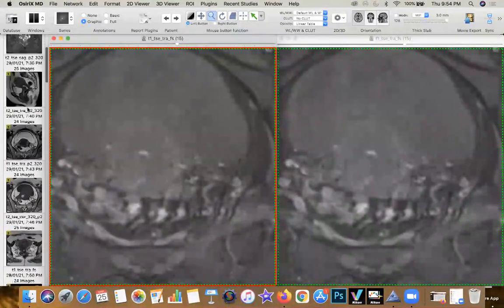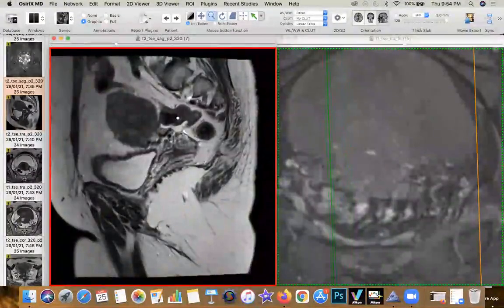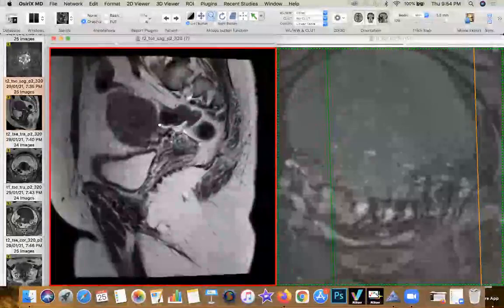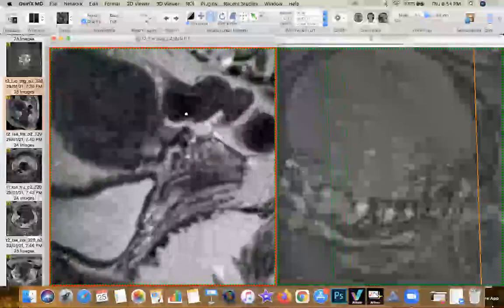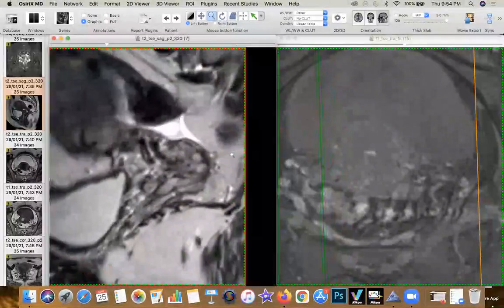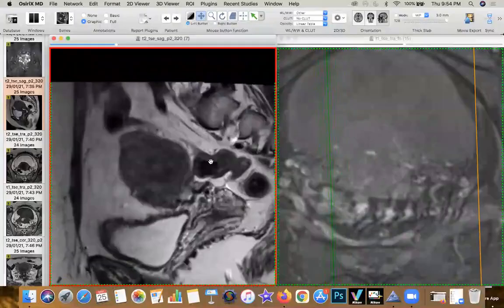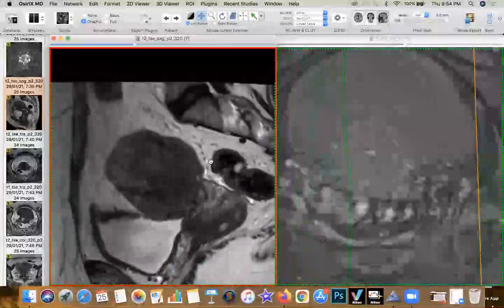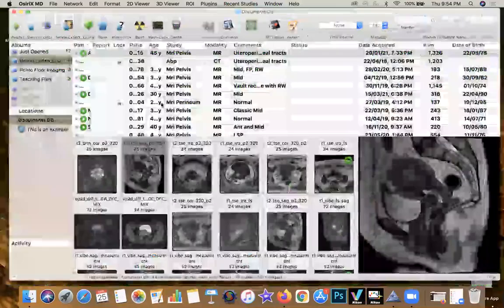Also, let's see whether this patient has any kind of tethering or adhesions. And of course, you can see that the rectum has gone in front and is loosely attached. You can see that black band sitting up here, and you can see focal tethering of the rectum as well. But it's not as significant as in the previous case, because you still don't see any rectal wall infiltration or any abnormal signal within the rectal wall itself. So case number 2 is iatrogenic dissemination of endometriotic tissue into the peritoneal space.